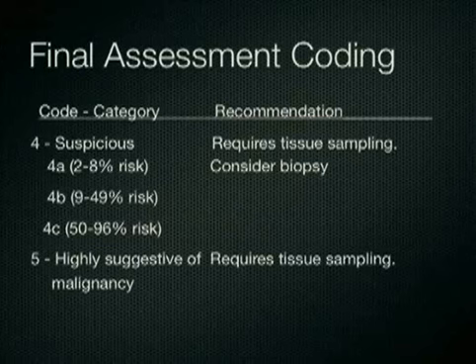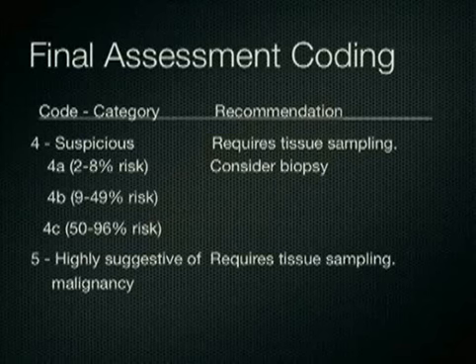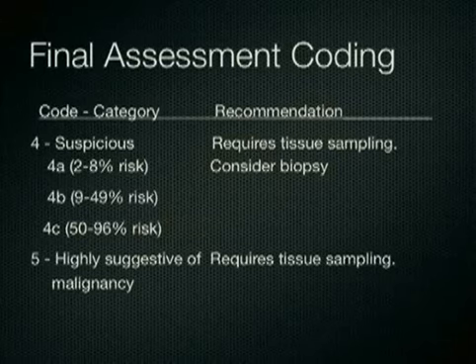More suspicious lesions include BIRADS 4 lesions and BIRADS 5 lesions, which have varying degrees of increasing suspicion for malignancy. In each of these cases, tissue sampling with biopsy is required. In summary, the BIRADS ultrasound lexicon has become an important adjunct to the BIRADS lexicon for mammography in the evaluation of patients with breast lesions and in the increasing use of ultrasound to complement mammography in this evaluation.